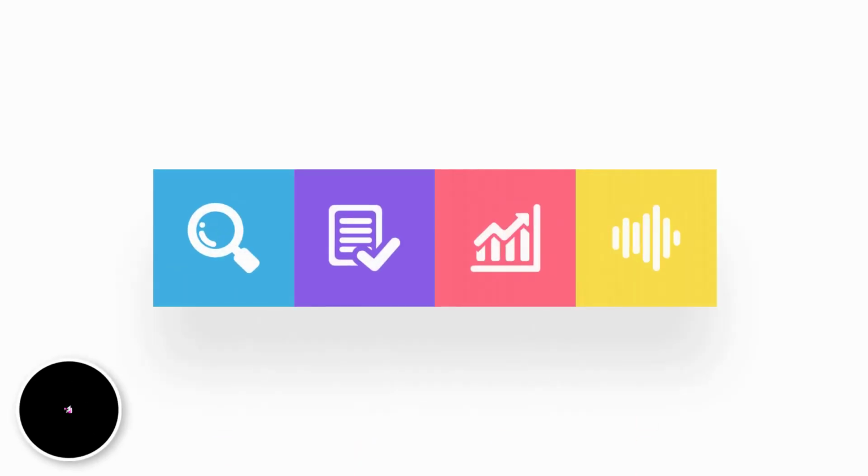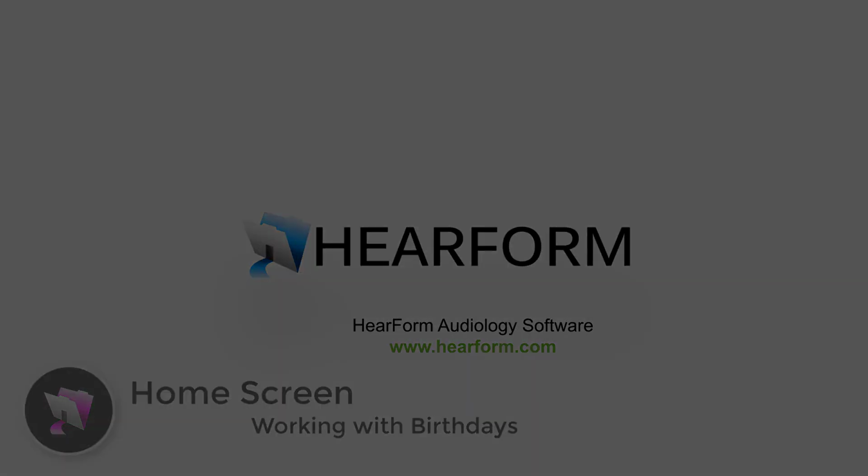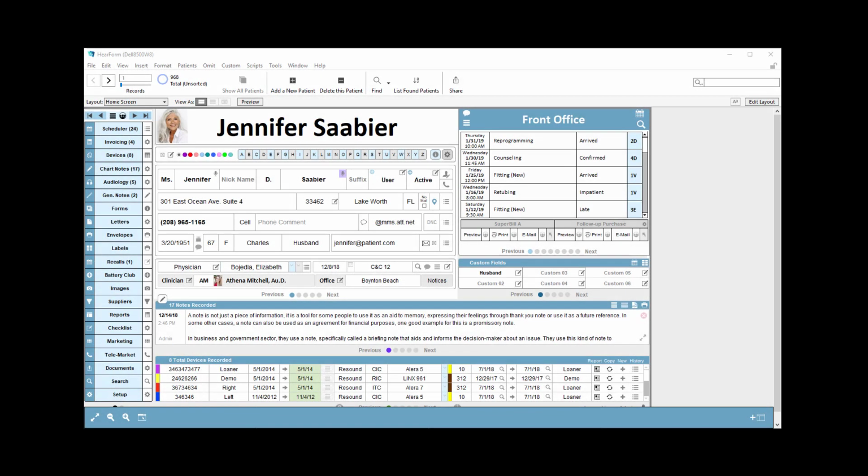Welcome back. This video will explain how to work with birthdays in HearForm Pro. There are a couple of ways that you can work with birthdays in HearForm.